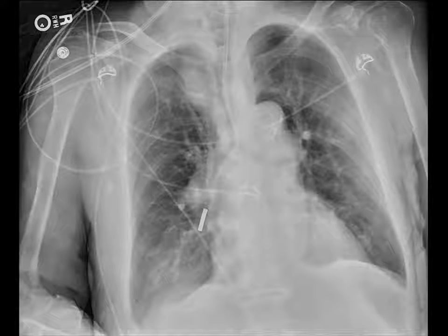This is a chest x-ray that should make you feel really nervous about not getting a chest film when you place either an NG tube or a Dobhoff. Of course we can see a Dobhoff here, and it seems to overlie the trachea. We can't really see the esophagus, can't confirm that it's in one or the other until we see the tip terminate in the lung field. You would definitely not want to use this tube for a feed. It could be catastrophic, and I hope that this kind of scares you, so that anytime you ever place a Dobhoff or an NG tube, you have to see the chest film before you start the feed.